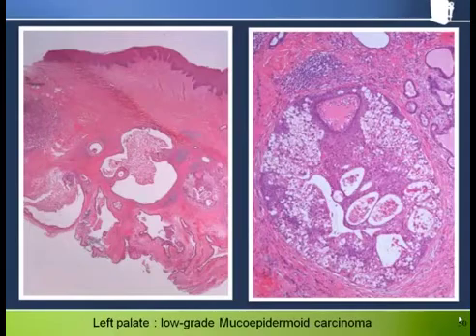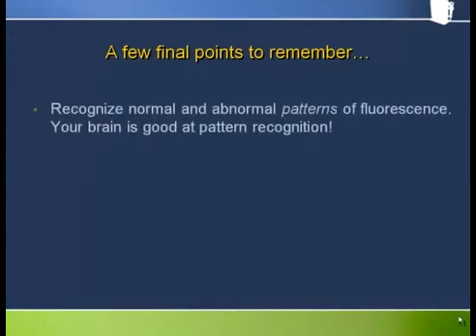In this particular case, we hypothesize that the loss of fluorescence arises from changes in the collagen matrix to allow and accommodate the growth of the salivary gland tumor in the connective tissue layer.